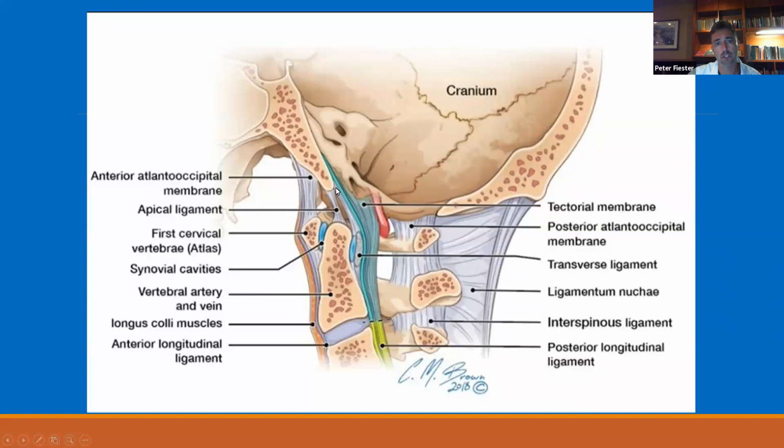As you move more posterior, you get into the superior band of the cruciform ligament, which runs from the basion and goes inferiorly to the mid-transverse atlantal ligament and forms a superior extension of the cruciform ligament complex. This ligament, again, is probably a minor stabilizing structure. You don't generally see it separate from the tectorial membrane, which is just posterior to it, and it's probably not the most important ligament in terms of stability.